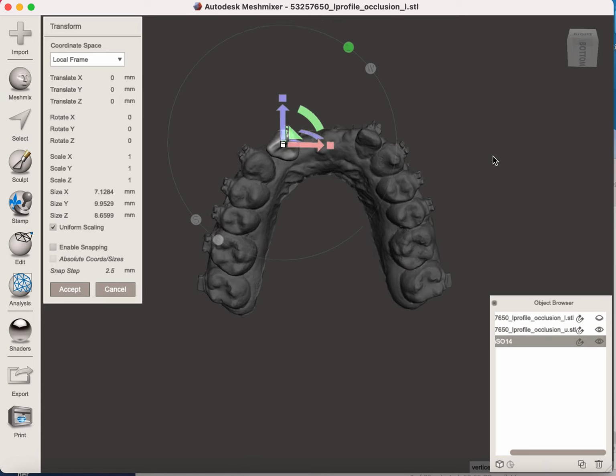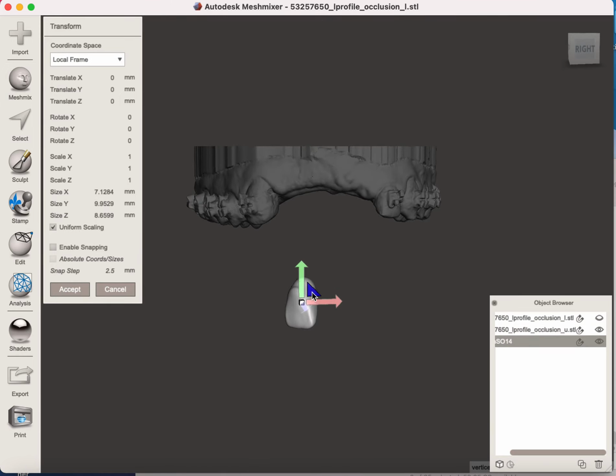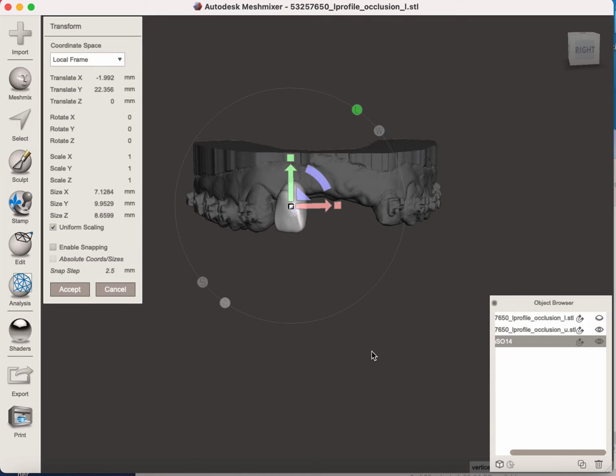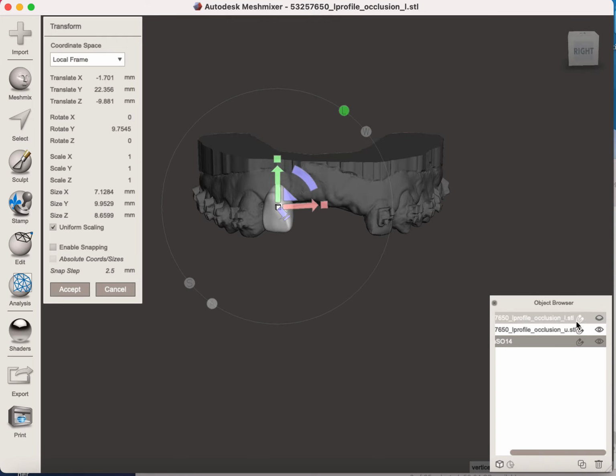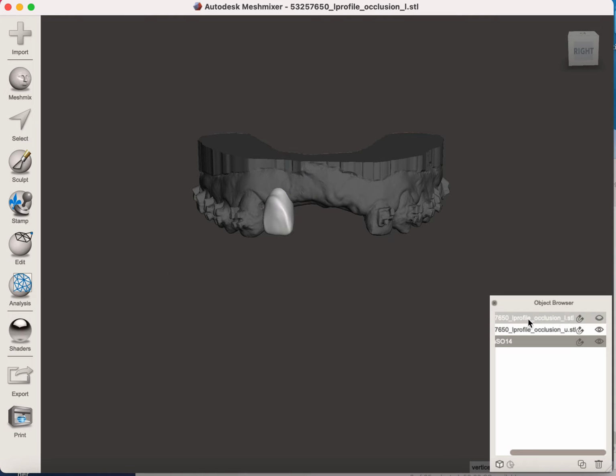Okay? Rotate it 90 degrees, move it up and down until you're happy with the vertical position, then get it back to the occlusal view, and now turn it in. Now the temptation might be to toggle to see how the overjet looks. I'm going to tell you don't do that, right? Wait for it, get it close, and click accept. If you toggle in between different files, it's going to make you redo it from scratch. So that's the disadvantage of a free software.